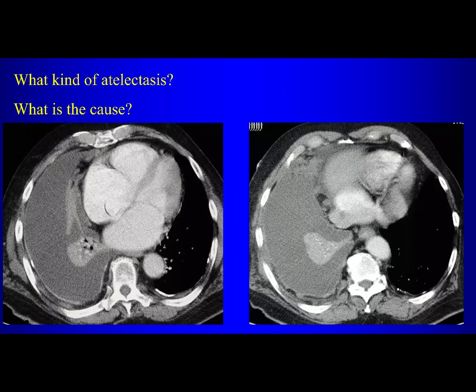Yes or no? Or do you think it's benign? Yes. So why do you think it's mesothelioma? Looks like on the second slice there's some chest wall extension. Well, where do you see chest wall extension? Kind of between the ribs. Between the ribs? To the chest wall. No, the ribs look okay here.